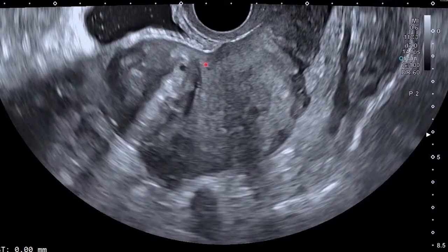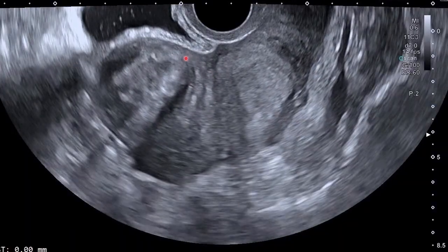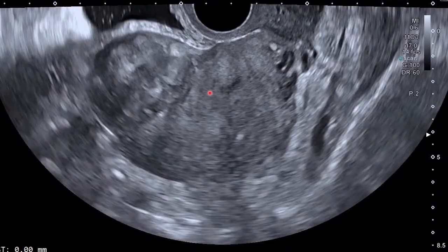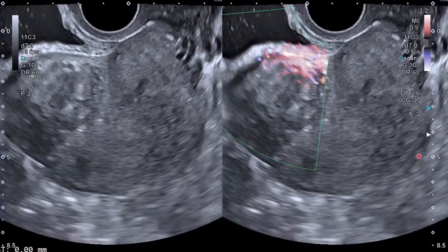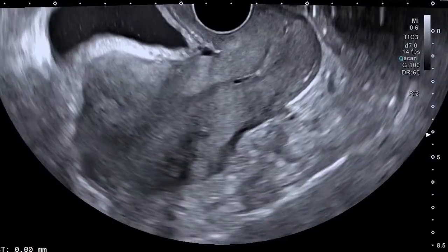it's a very rare finding, if not one of its own. So I hope you are also giving your differentials. If you think otherwise, please send your thoughts in the comment section and say what you think this could be.